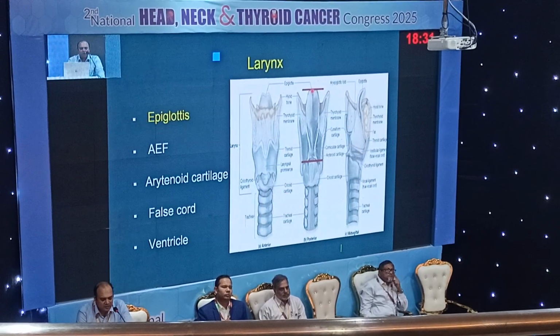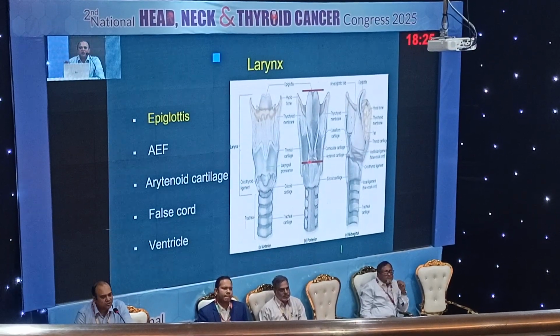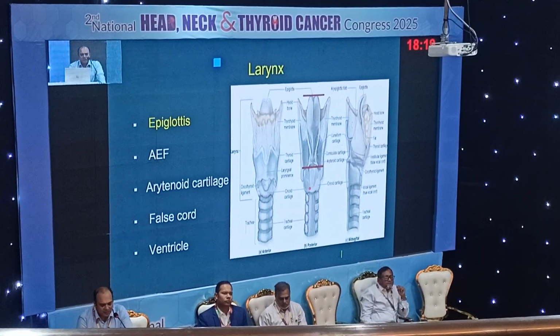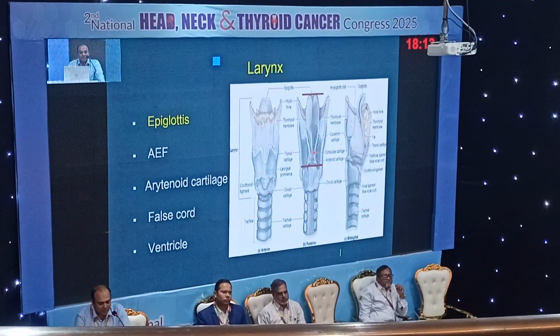Supraglottis extends from the tip of the epiglottis to the cricoarytenoid joint. If you see the cricoid cartilage, arytenoid cartilage, and thyroid cartilage in the same CT plane, you say you are at the level of the glottis. Anything below that is subglottis, and this is subglottis. So the biggest area is supraglottis. That's a big area, the largest compartment in the larynx.